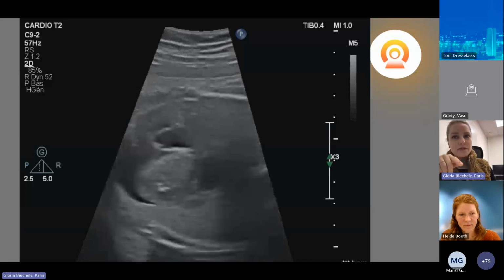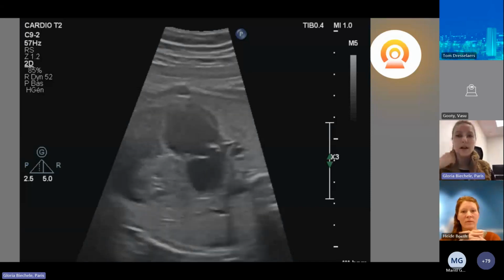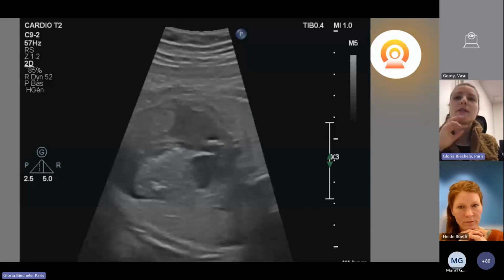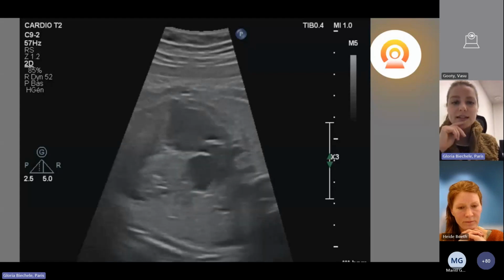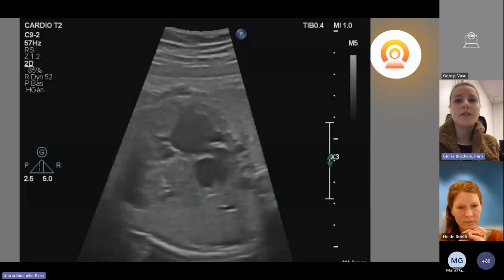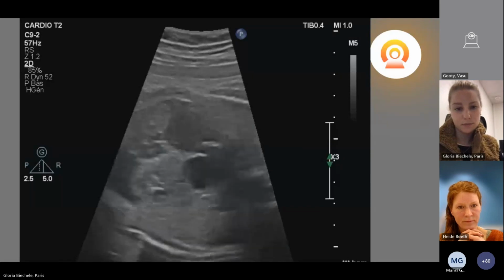Only the right ventricle revealed satisfactory systolic function, what we already assumed after the MRI, and mitral aortic continuity was difficult to see due to the bulky tumor. We saw no septal aortic shift or septal defect, and recently a small pericardial effusion lamina appeared.